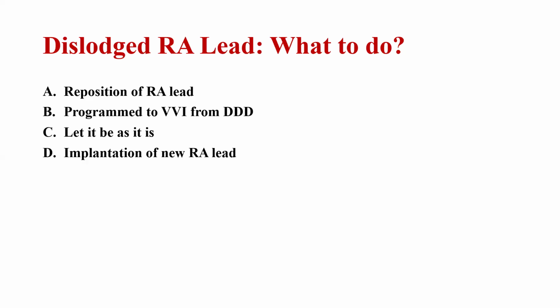And many patients just go to the village and remain like this. Virtually, the ECG you showed is a VVI, with no atrial benefit.